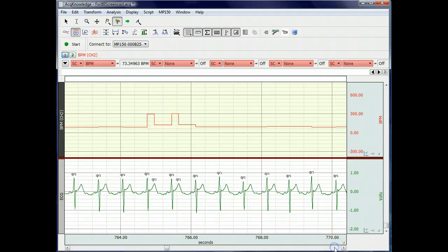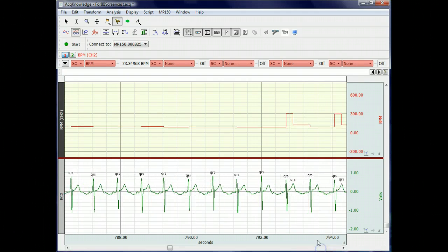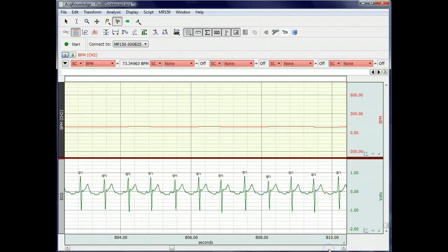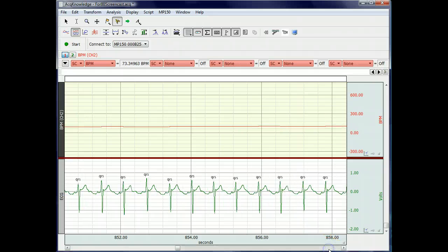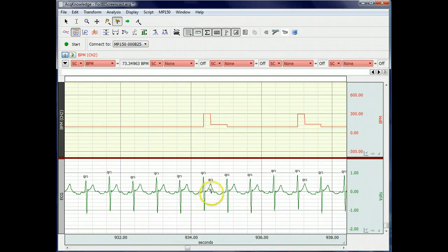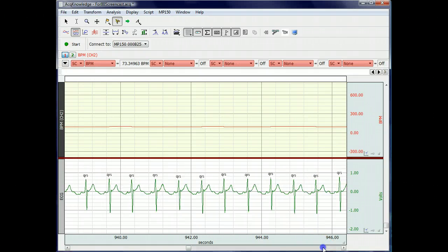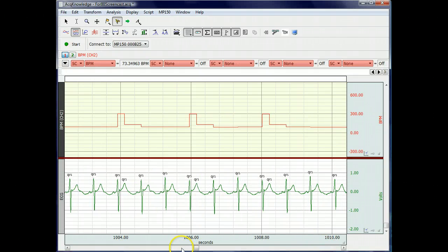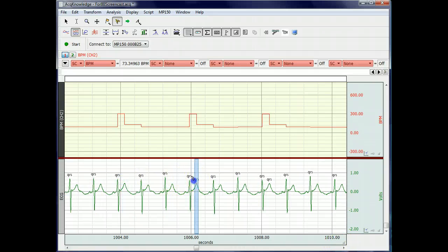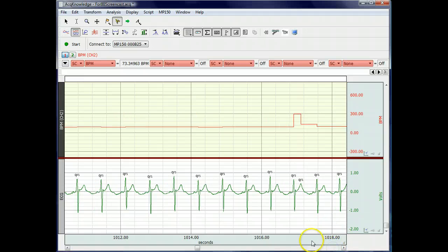Okay, generally it's kind of obvious like that, right? Okay, and you don't actually have to be really careful the first time through, because what you're going to find is you'll iterate this procedure. So any that you miss, you can quickly identify and go back and repeat this as necessary.